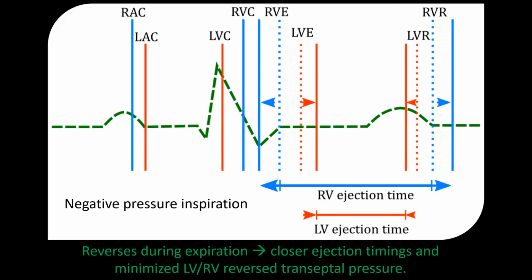The main element that makes those changes more obvious with respiration in those 2 pathologies is pericardial constraint. With a fixed cardiac volume, any intrathoracic pressure changes that affect the RV loading inversely affects the LV loading. The LV ejection time thus changes, which is atypical for most other cardiac pathologies. As such, the septal shifts are thus exacerbated both in inspiration and expiration. This is the echocardiographic equivalent of a paradoxical pulse.